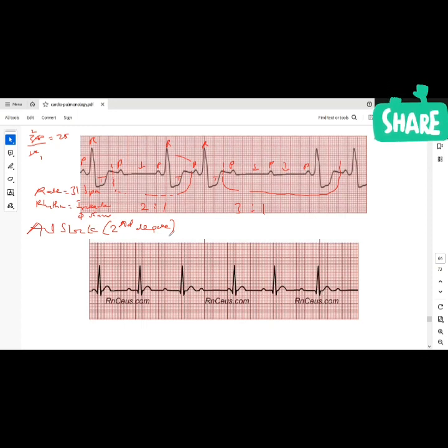It is bradycardic, rate about 50. Okay. So we're doing some sort of bradyarrhythmia, correct? Okay, go ahead. Then the rhythm is irregular. Okay, rhythm is irregular.